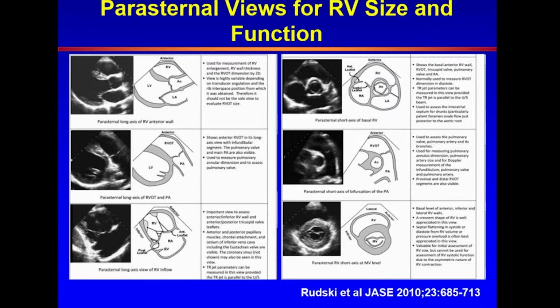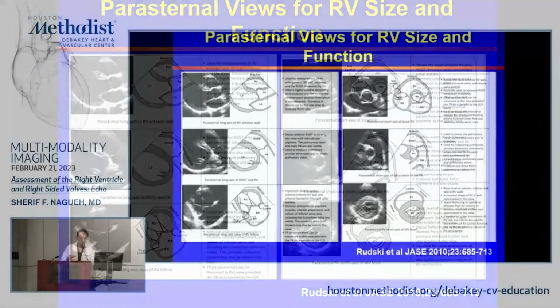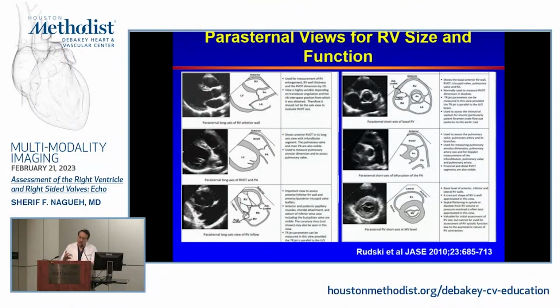As we will see, they have different arterial supply, and in patients with coronary artery disease, you may see segmental dysfunction. And of course, if there is a global reason for RV dysfunction, you will pick it on both of these walls. We also see the tricuspid valve leaflets. We see both papillary muscles. We see the chordal apparatus.